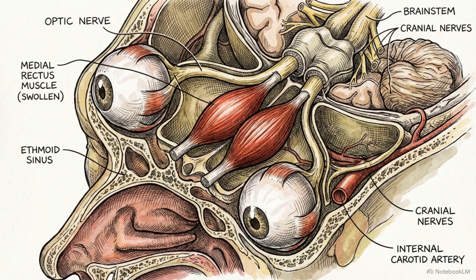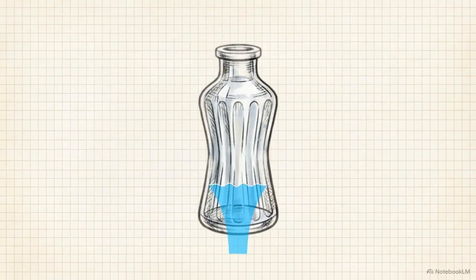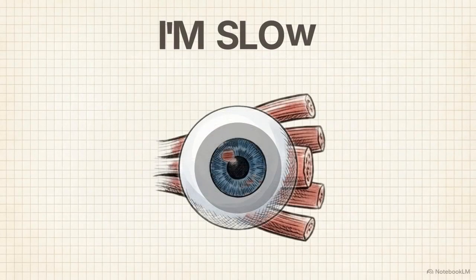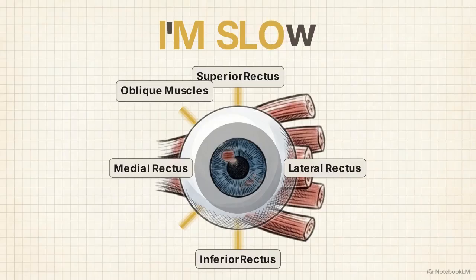This generated medical illustration shows the morphological tiebreaker for thyroid eye disease. It inflames the muscle belly, creating a bilateral Coca-Cola bottle enlargement, but characteristically spares the thin tendinous insertions attaching to the globe. This Coca-Cola bottle sign is the reliable hallmark of the osmotic edema and fibrosis caused by thyroid-related inflammation. A secondary diagnostic pattern for thyroid eye disease is the I'M SLOW mnemonic, which outlines the hierarchy, starting with the inferior rectus, followed by the medial, the superior rectus, lateral, and oblique muscles.